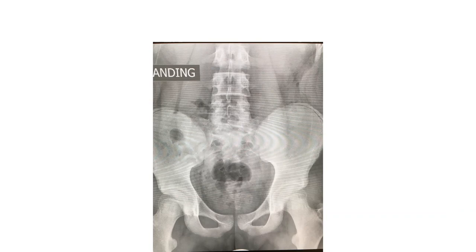That doesn't look like it's closed. Well, that's called spina bifida occulta. The bone actually didn't fuse together there when this formed at 6 to 8 weeks of life during the process of neurulation and ossification of the vertebral somite. And that area right there is not fused. And I can pick that up on the X-ray.